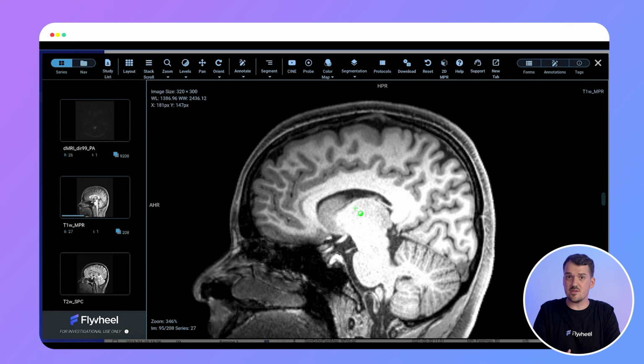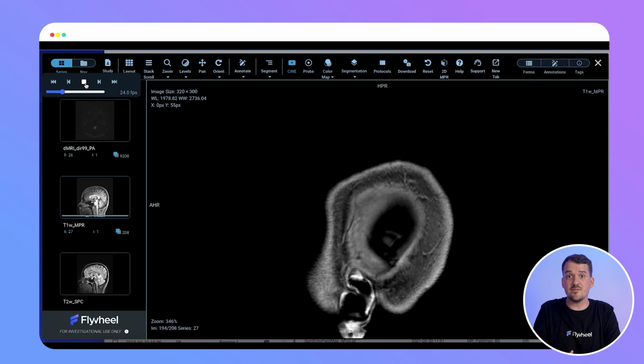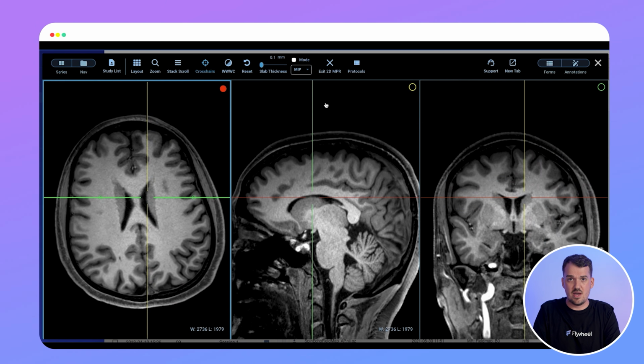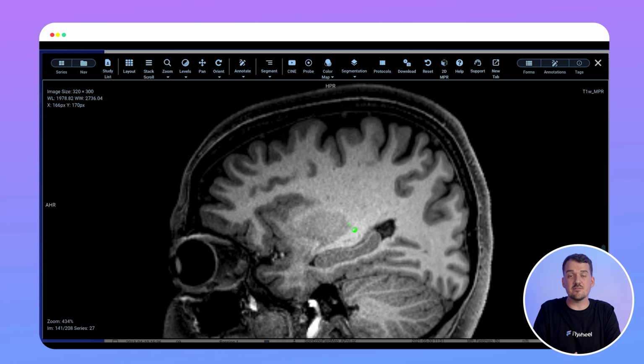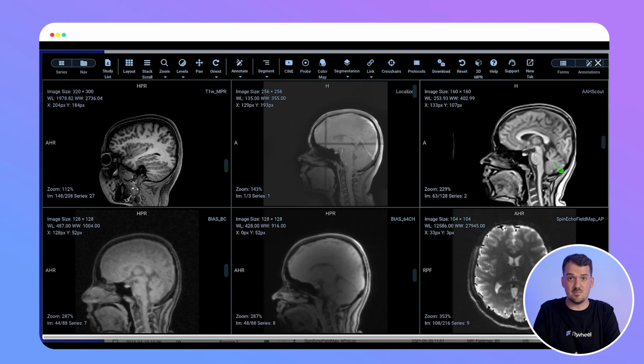We can see that this session has a number of medical imaging files that are grouped into acquisitions. We have several brain scans, including structural and functional images. After inspecting the first batch of data as is, we can set up a pipeline of data curation steps to make sure we are optimizing the usability of these images.